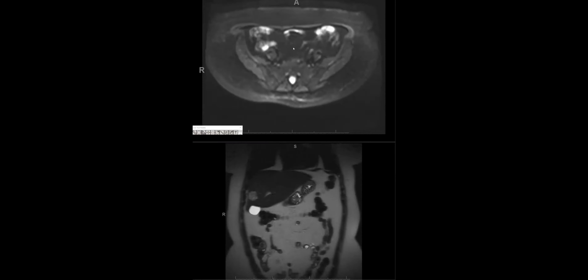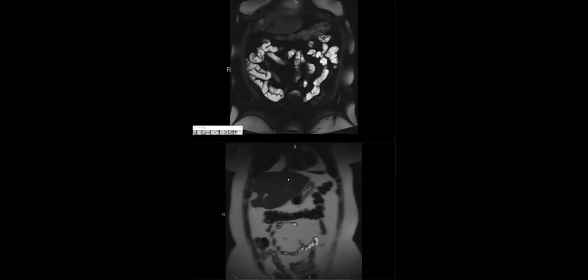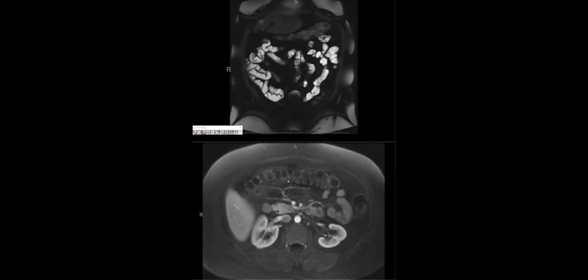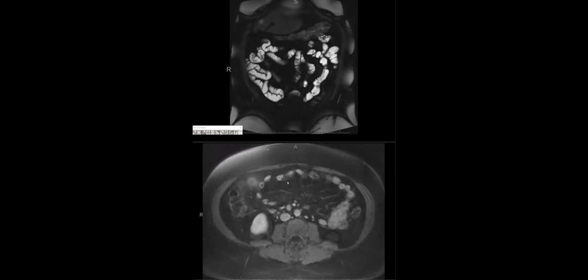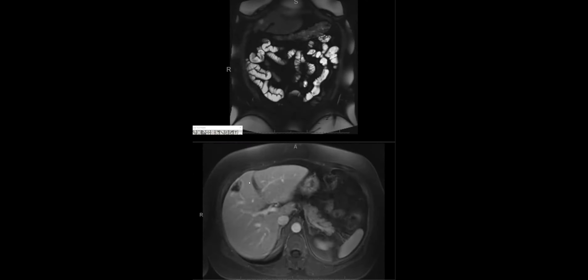Well, sometimes we see these things that we think are sclerosing hemangiomas, but we don't have the old imaging to be sure. This was one where we have the old imaging so that we can be sure. Very nice. I was wondering if you were going down the ciliated foregut duplication cyst route. Yeah, those are also in this location, but no, I don't think this is one of those.